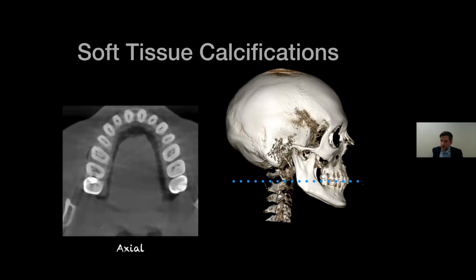Someone had said, I personally like to make a pan from the scan, and you could correct a poorly positioned patient in the scan software. In the example that you showed, the pan looked distorted. Is this because the scan position was not corrected by the software prior to converting to the pan? Yes, that is why the scan looked like it was not oriented properly.